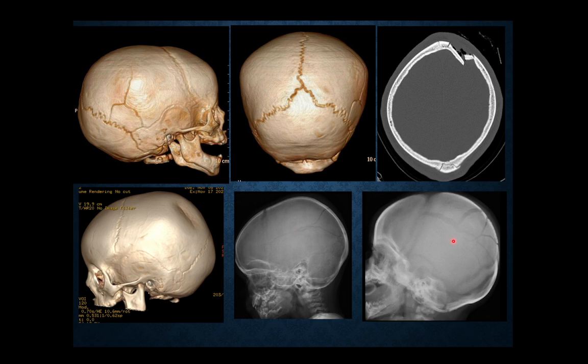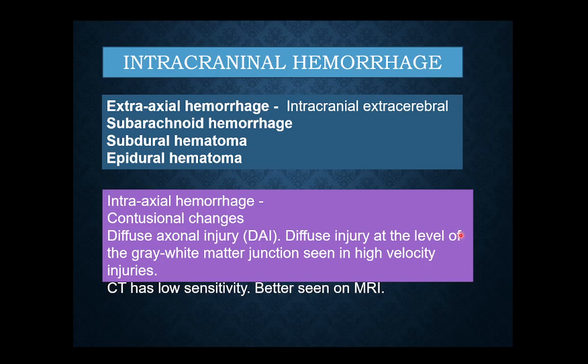Now in this image, this is the recent fracture, and this patient was followed later on. Here the same fracture shows widening of the space because of some chronicity of the fracture. So it is important to see whether it is getting closer or showing more diastasis. If there is more diastasis, there are chances that the dura extends through this defect and causes a leptomeningeal cyst.